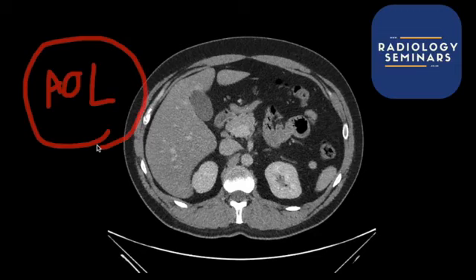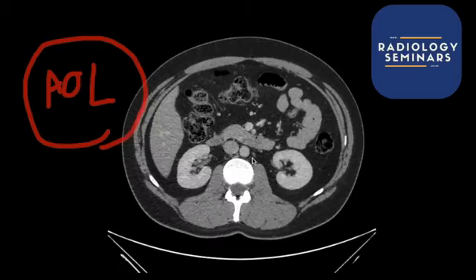It sounds so silly, but I remember when I was beginning radiology, I used to have difficulty knowing which of the two vessels was the aorta. And thankfully, that's not too much of an issue now. It's almost second nature. But I think some of what I'm trying to do here is cater for all levels. So AOL, American Online, is a good way to try and remember which one of these two vessels is going to be the aorta. And so AOL means aorta on the left.